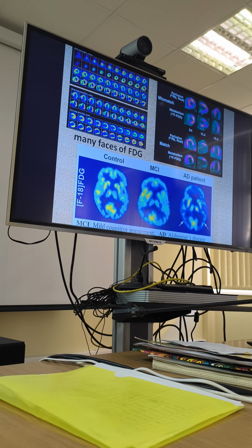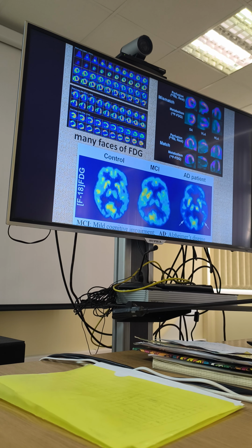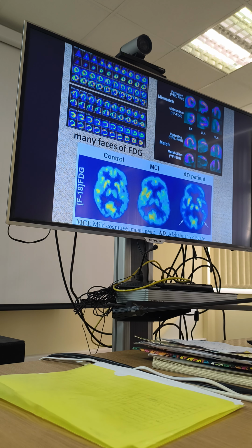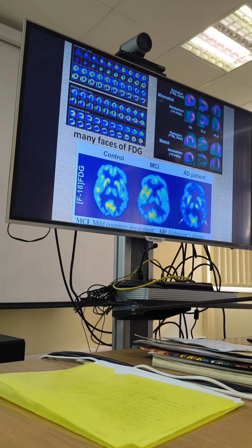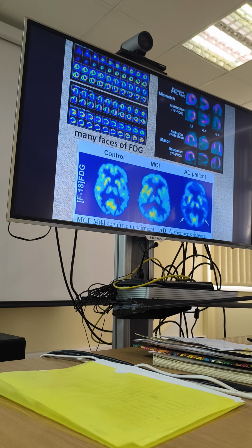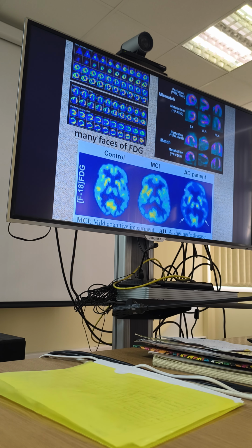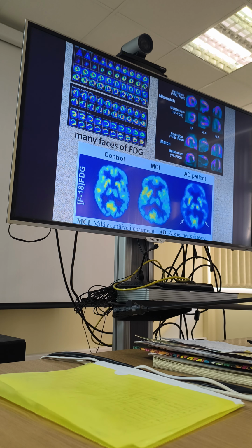And this is the brain of the patient with Alzheimer's disease. Actually, the word is Alzheimer because it's a German word, a Swiss word. But anyway, at the origin it was Alzheimer because it's a Swiss last name. Okay, and you see the difference. So this is working brain, this is brain of the patient with dementia, severe dementia. And this is a big difference.